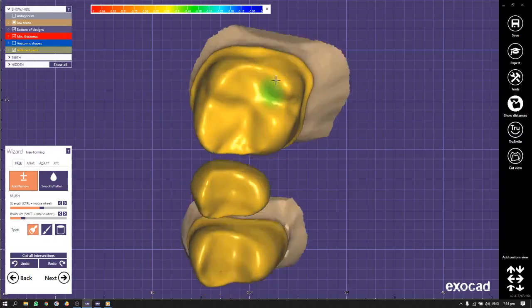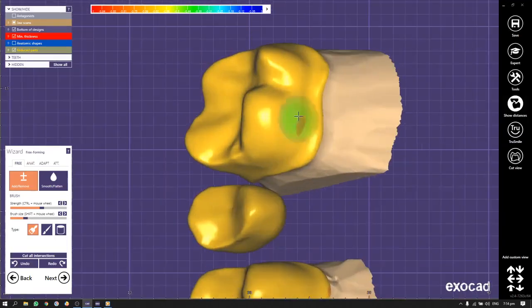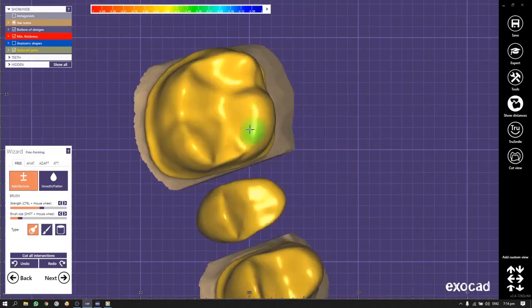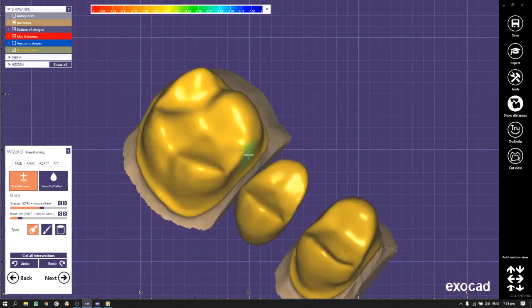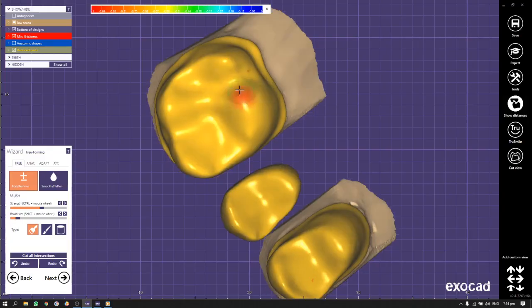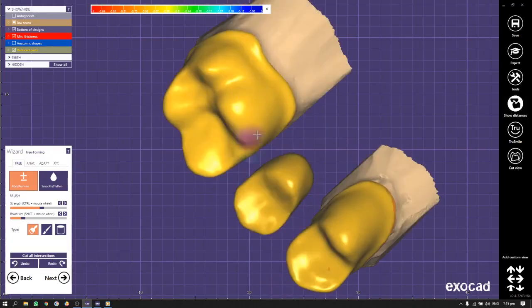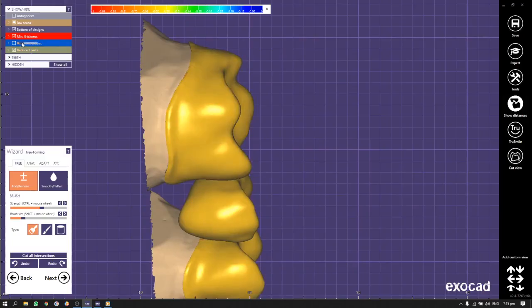Tooth number 6, the same quite sharp areas. So I'm holding, clicking and smoothing. With left mouse button we do click and we smoothen it out. Adding, smoothing. So without changing proportions and sizes, I'm doing them more smooth. So dear friends, it will come with experience. Do not be afraid. I told you maximum 3 years and you'll succeed.